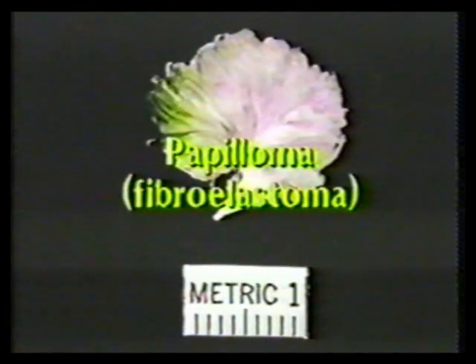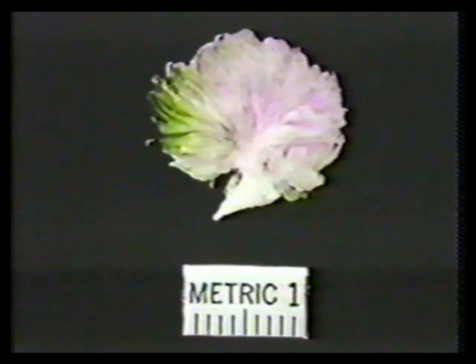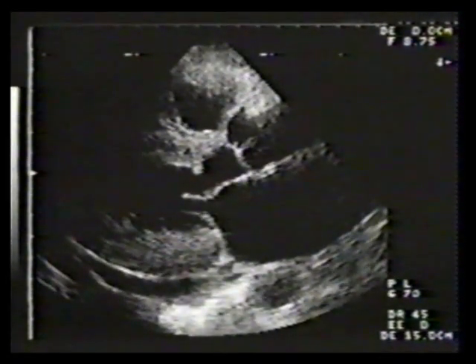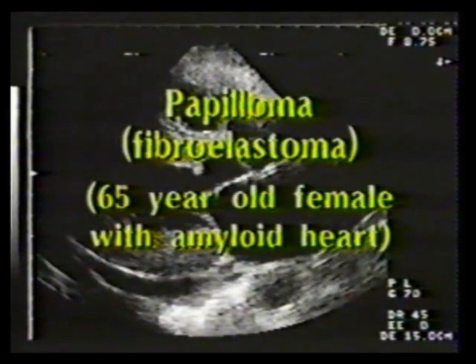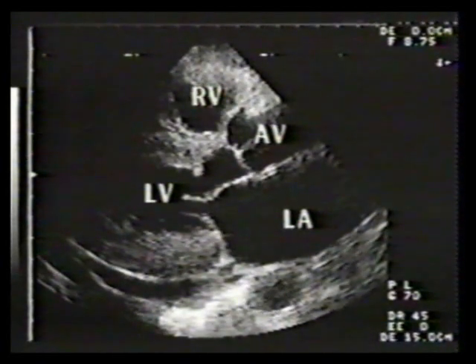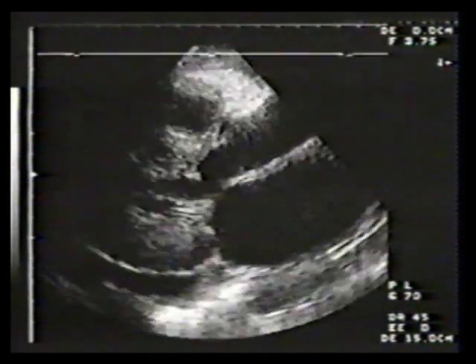The next most frequently encountered benign tumor is the papilloma or fibroelastoma, which is a small pedunculated finger-like mass found on the endocardial surface of atrioventricular valves or ventricular myocardium. This is an example of a fibroelastoma in an elderly woman with amyloid heart disease. Note on this parasternal long-axis view that there is a small pedunculated mass in the left ventricular outflow tract.